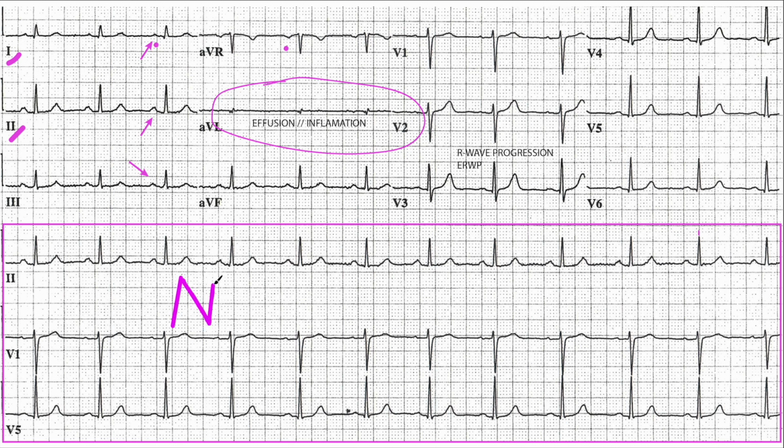You would say, okay, I have normal sinus rhythm at 70 beats per minute. And that sounds so textbook perfect that if you left it at that, this ECG would probably get ignored. However, when you add to it that you have early R wave progression, all of a sudden the flag goes up.